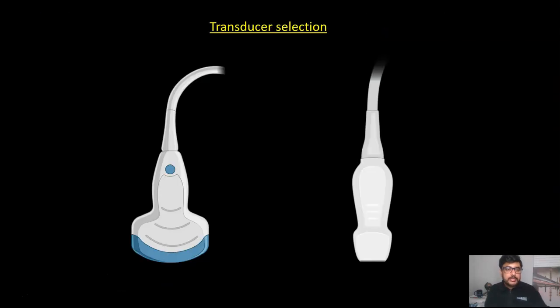So VExUS provides an add-on value to right atrial pressure in predicting organ injury. And not only that, these waveforms are so dynamic and change with therapy in real time. That way we can use them to monitor the response to the therapy that we are giving.